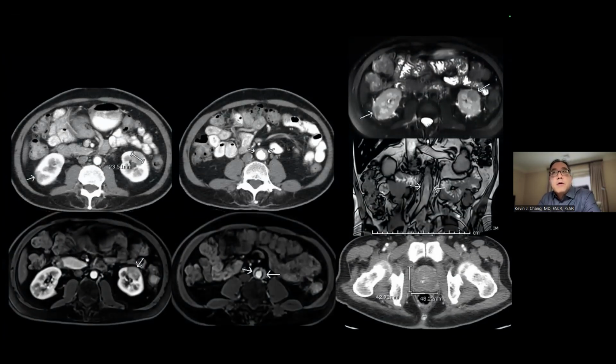Here's an example of extra pancreatic manifestations of an IgG4 related autoimmune pancreatitis. In this case, this patient had renal lesions here, which can look like renal masses. It's difficult to differentiate from renal masses. The ones I've seen can look hypoenhancing with diffusion restriction. Sometimes they don't look very mass-like. It could look like a bilateral pyelonephritis without the clinical features or typical symptoms of pyelonephritis. In this case, this patient also had a rind of soft tissue around the aorta, in a patient with an aortitis related to IgG4 related disease.